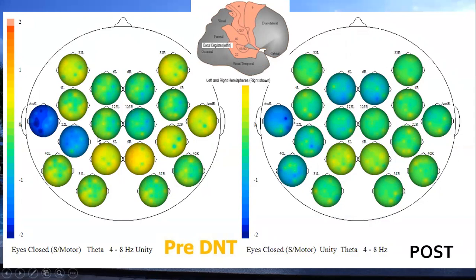This is recruitability, area 5, personal boundaries, how recruitable you are. Sometimes it's associated with aggression, sometimes aggression inwards, which is depression and even self-harm. And you can see that's gotten normalized. Still got that auditory, and this is part of the auditory system. That's 22, that's right next to the auditory area, primary and secondary. But a lot of green going in there now, very nice, very balanced.